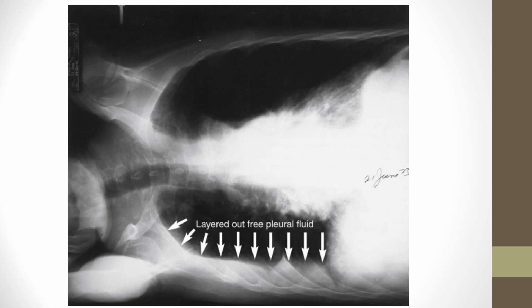So this is not loculated or trapped by anything. So this is most likely a transudate, but you never know.